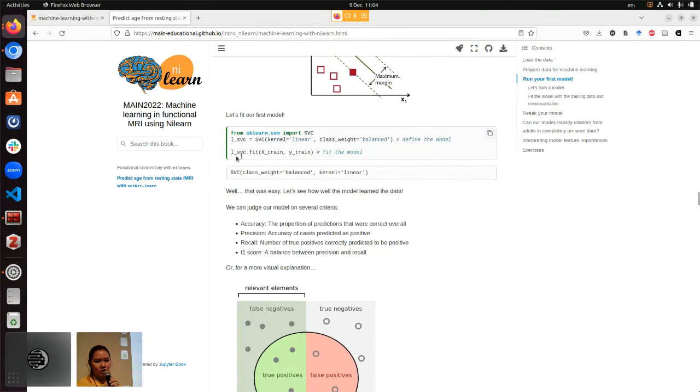So the first thing we will need to do in the scikit-learn interface is to define your model. And you might have noticed this is a very similar setup as when we are using the maskers, when using the connectome matrix generation in Nilearn. And this is a deliberate design. We are trying to make sure Nilearn uses the interface style designed by scikit-learn, because it is a really good standard. We want to make sure there's less friction when people are using these kinds of things. So first thing you need to do is to fit your training data into a model.